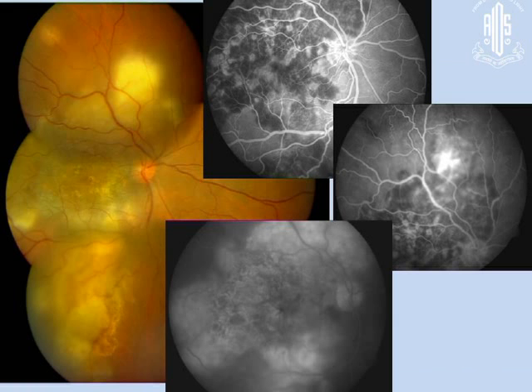You have active edges, you have inactive edges. If you clearly see these edges, they are hypo. They are hypo in the initial frames, in the early frames within the first 1 minute, and then they all become hyper in the late phases. And this is the clue here. This is nothing great. You cannot miss these findings if you clearly see.